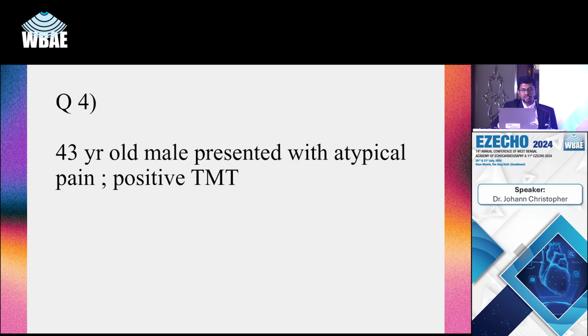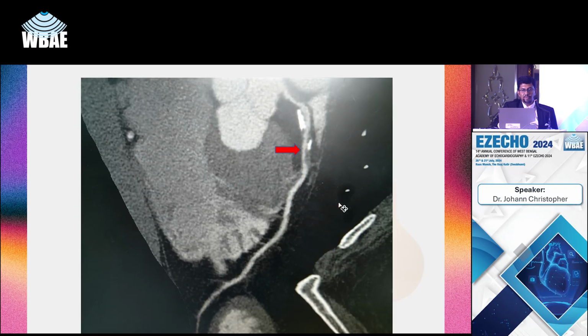Remember the sensitivity of the treadmill and look at the image carefully, because we now are not only looking for quantification, but we are also looking for the histopathology of the lesions before we make a call. So the red arrow is showing, and these are your questions.